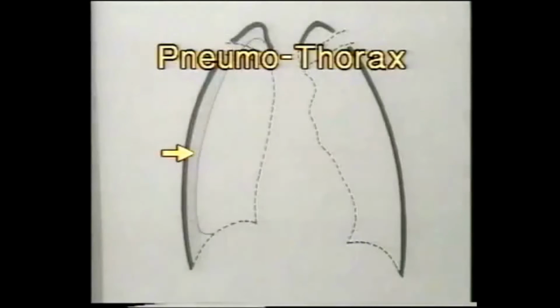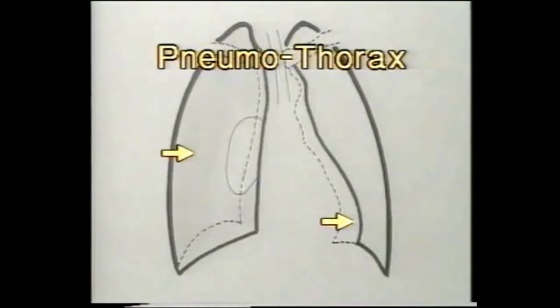Pneumothorax. Pneumothorax is a collection of air in the pleural cavity. It produces a partial collapse of the lung and is seen as a uniformly black peripheral shadow outside the lung border with absence of vascular markings. When large, it produces a complete collapse of the lung and shift of mediastinum to the opposite side.